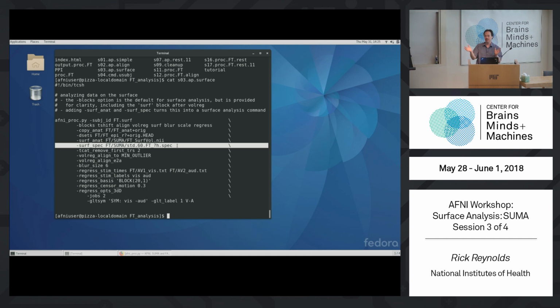Left side, right side, if you have them. Typically, in our surface analysis, we separate the hemispheres, though. We analyze one hemisphere at a time. I think the GIFTI data sets can process both at once, maybe FreeSurfer too, but our software doesn't.